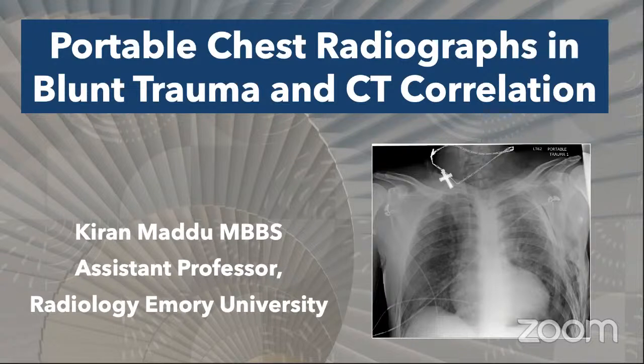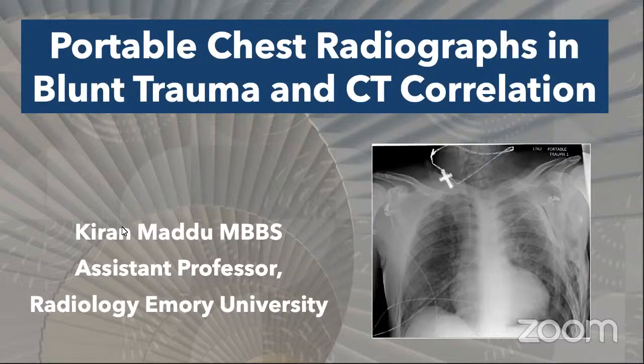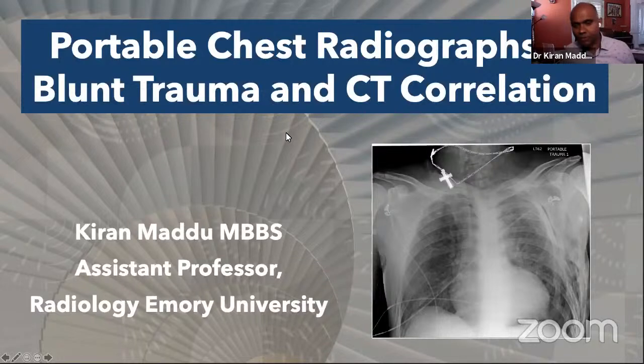So good morning, everyone. Today I'm talking on portable chest radiographs in blunt trauma. In most of the cases, I'll try to show you the CT correlation so that you will understand how exactly we will be managing the patients.